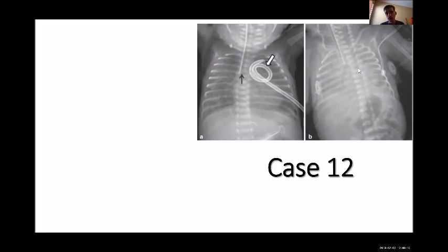The X-ray is taken more from the right side, so we see right more than left. And you can see here, that's 1, 2, 3, 4, 5, 6, 7. So it's an underinflated lung. And also you cannot see the diaphragm, you cannot see the heart, right? The silhouette of the heart disappeared. So there is either complete atelectasis or collapse, or you're losing the alveoli.